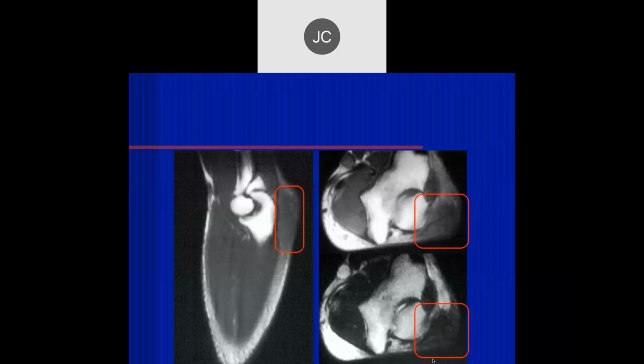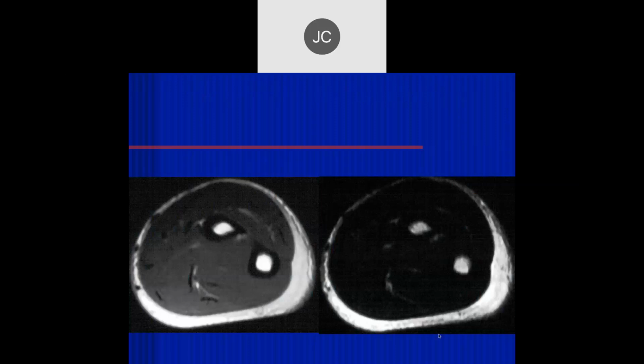So what's going on here? I'd be concerned for bursitis. The signal intensity is low on the T2, so it's not a typical straight fluid collection. Maybe a hemorrhagic bursitis. Right. So this was hemorrhage, and I think that was from direct trauma. Similar symptoms in this patient.